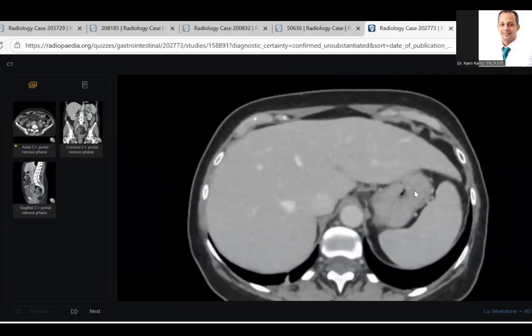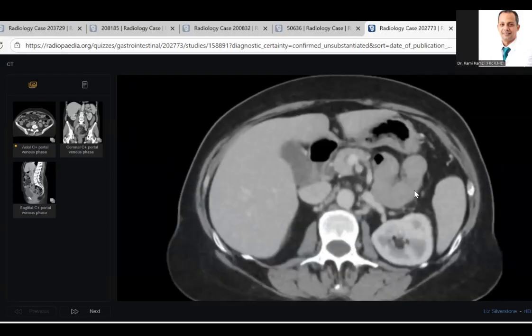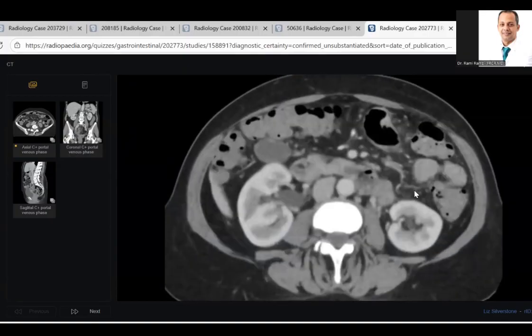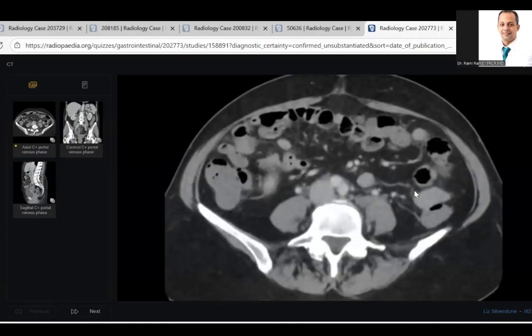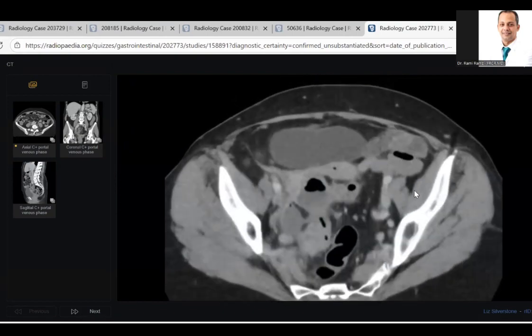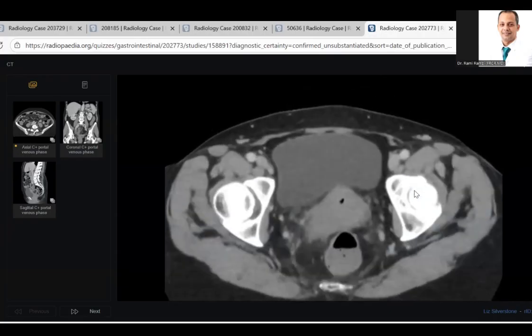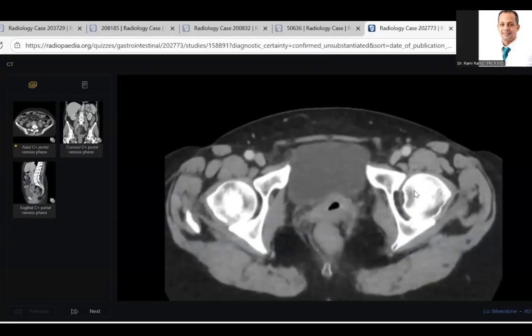I am provided with CT portal venous phase images of the patient who presented with acute abdominal pain. First, I want to look at the entire stack before commenting. Okay, I could not spot any abnormality in my first go, and I would like to see again.